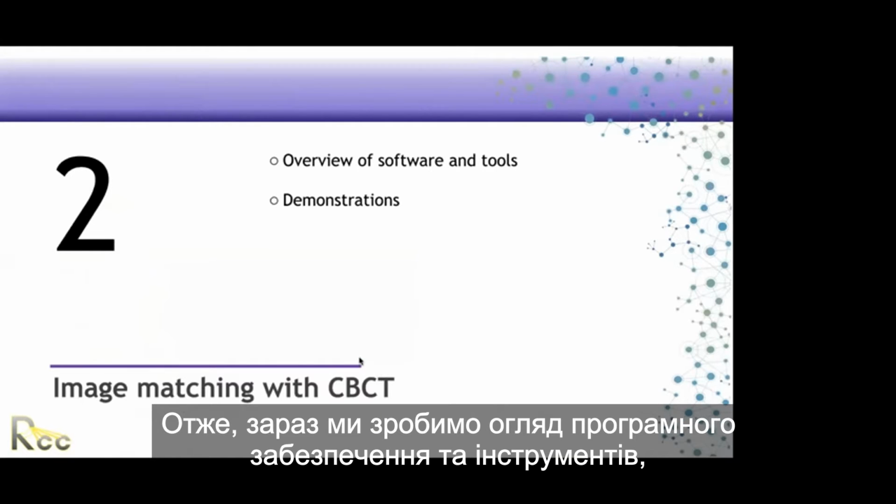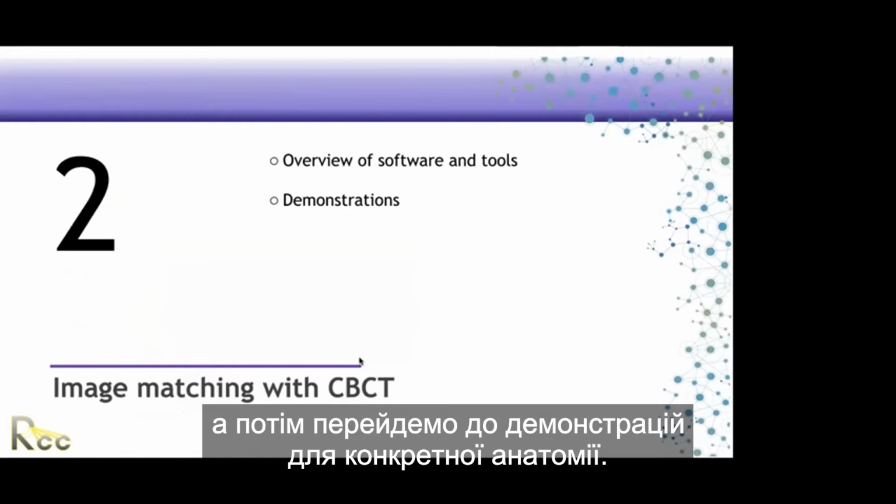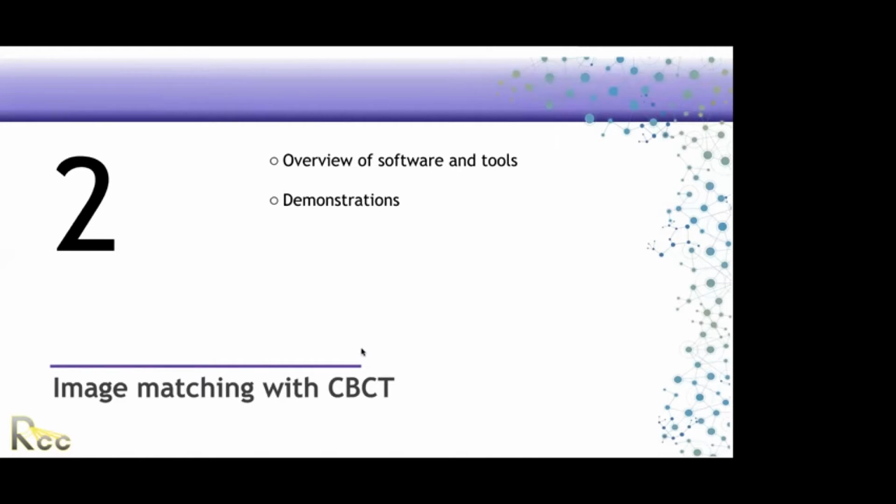Now we're going to do an overview of software and tools, and then go over demonstrations for a specific anatomy.